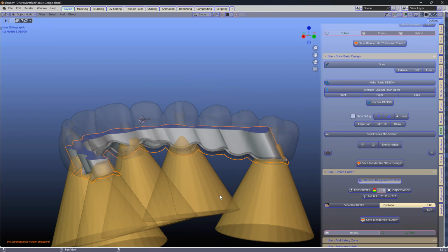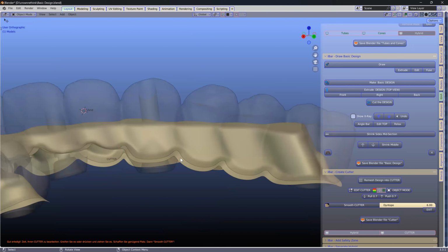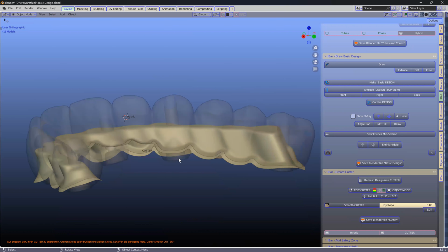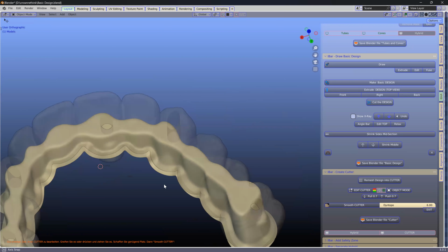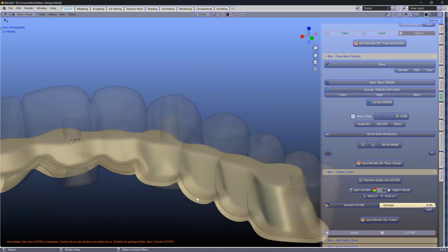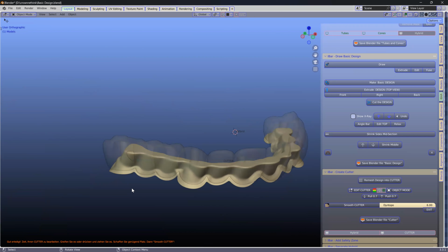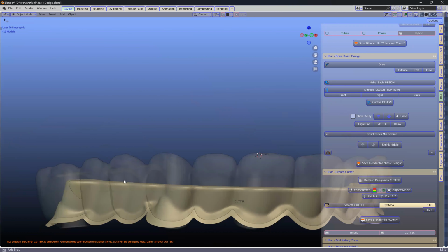Okay. This just takes a bit of time, depending on your computer speed. There's a lot of things going on. So just wait. Okay, so here we've got the cut. The sharp edges have also been rounded because we don't want any sharp edges. You'll see this cutter juts out a little bit on the outside of the hybrid, and so it must, because otherwise it's not going to cut through your hybrid.